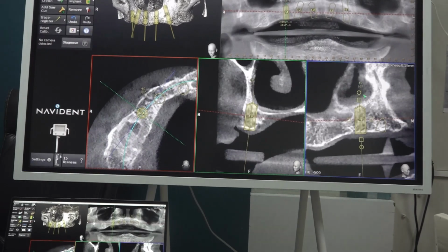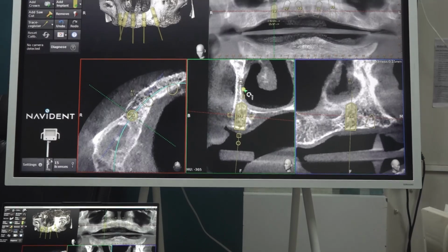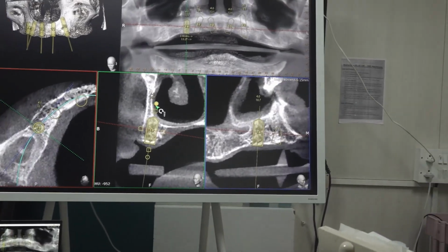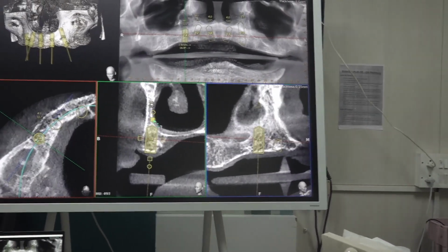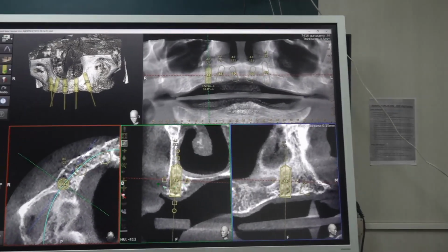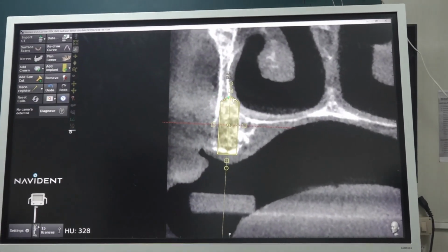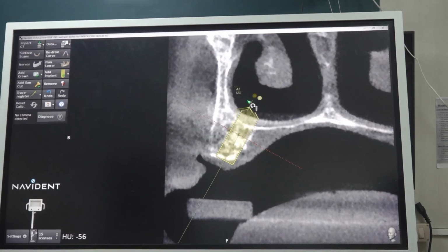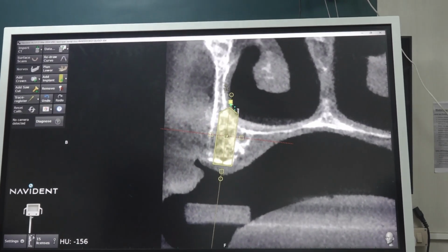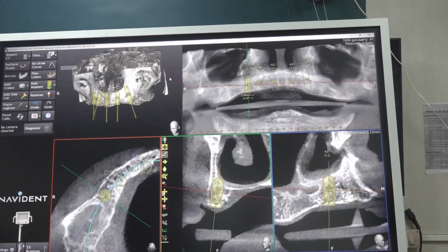Okay. Sir, compressive implant or tip will be narrow, right sir? Yes, yes. Here the bone is also narrow, no sir. Yes, we can engage this. Yes, yes. We can increase the length. We can increase it. If you want to do like that, you have to drill along the labial wall. You should not angle it through the sinus. Yes. So you can place a little 1 mm or 3 mm longer.